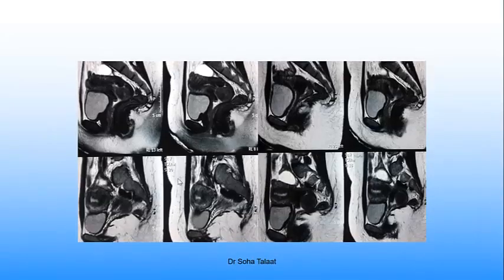But here, this pedunculated prolapsed mass coming out from the cervix to reach the upper vagina has a pedicle coming from the anterior myometrium. It has a pedicle coming from the anterior myometrium, and then here note the signal intensity. It is hypo- or iso-intense to the myometrium. It is hypo-intense on T2, with fibrous tumors, so this is a fibroid.